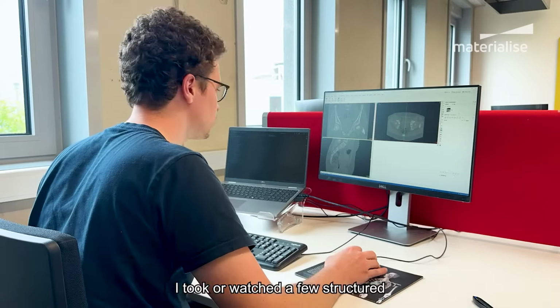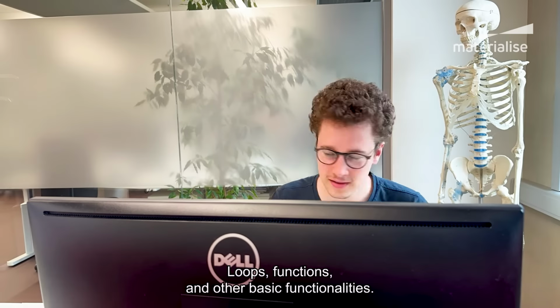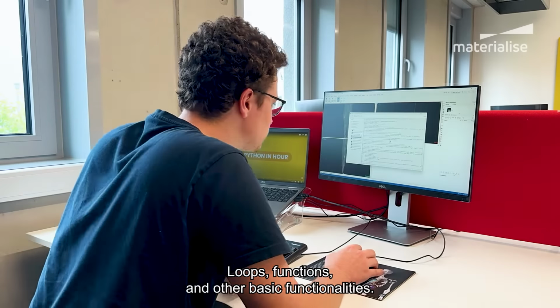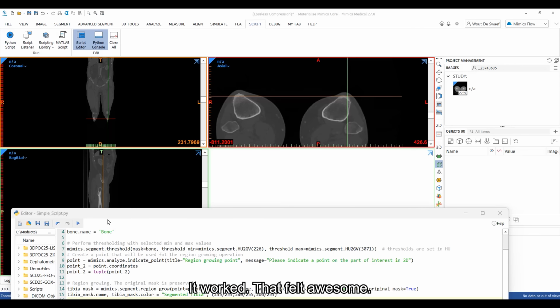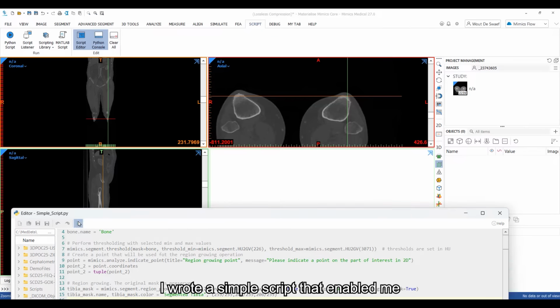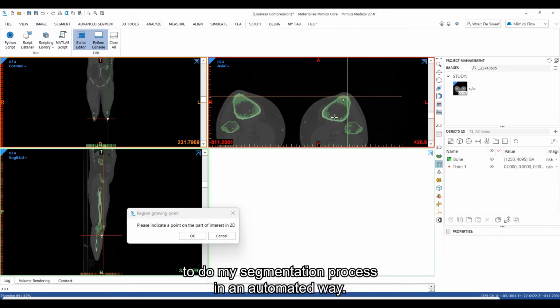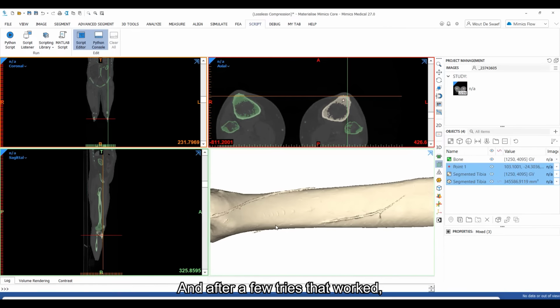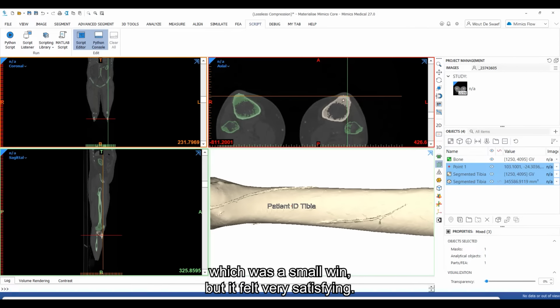I watched a few structured online lessons and then it clicked again. Loops, functions and other basic functionalities, it all came back to me. And then I felt ready to start writing my very first script. And you know what? It worked. That felt awesome. I wrote a simple script that enabled me to do my segmentation process in an automated way. And after a few tries that worked, which was a small win, but it felt very satisfying.